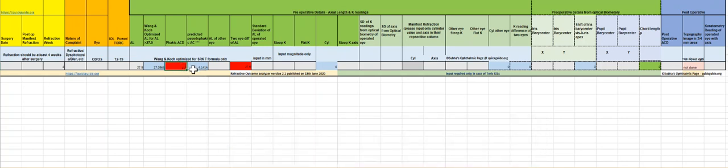What it also gives me is the predicted post-operative pseudophakic ACD. The predicted post-operative pseudophakic ACD is automatically calculated when you put in the phakic ACD, and this may help you in your effective lens position, I mean where the lens might be sitting, how far it is sitting from the cornea, and this may help you to determine if there has been a refractive surprise. You can go back to this and see how far the predicted post-operative pseudophakic ACD tallies with your real pseudophakic ACD when you measure after the lens implantation.